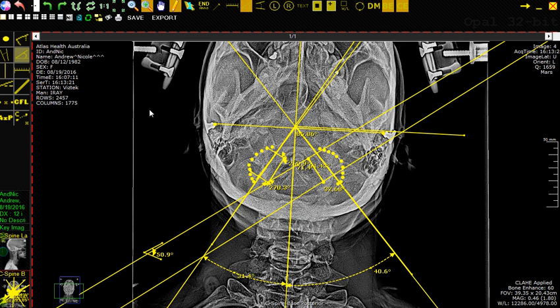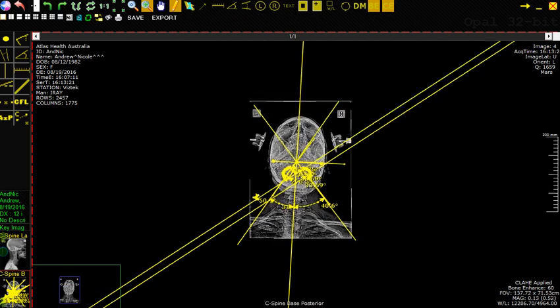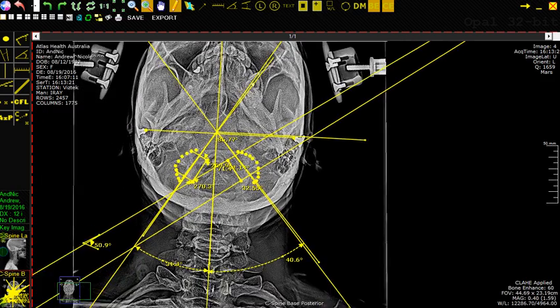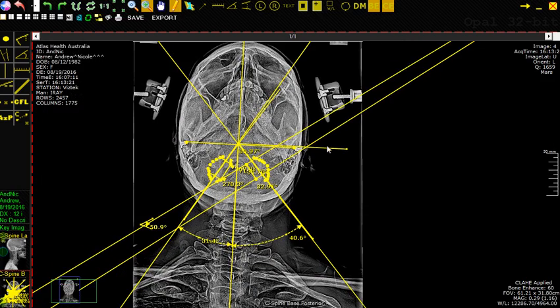So let me zoom out just a little bit here. Well, we'll try to zoom out. There we go. Okay, I might have zoomed out a little too far. Let's zoom in. Yeah, too far. Okay, that'll actually be perfect.